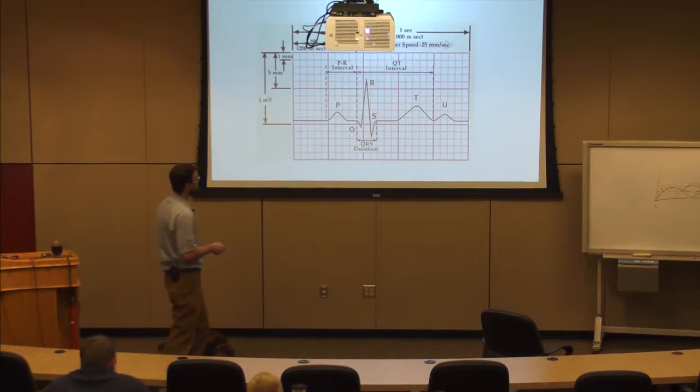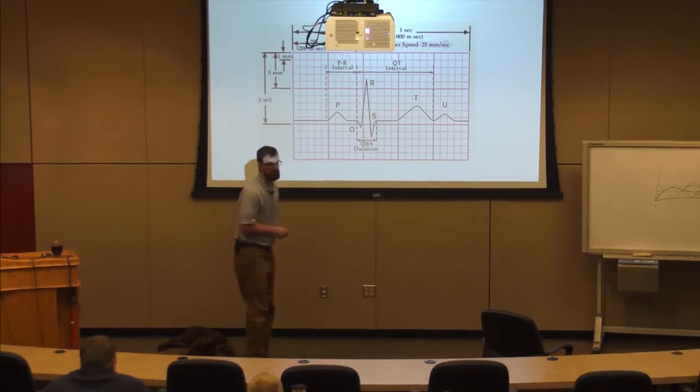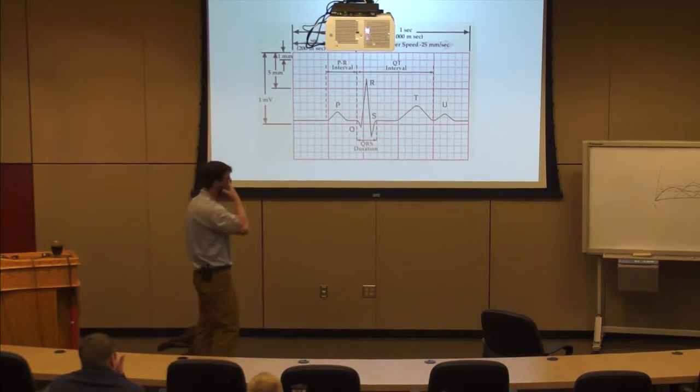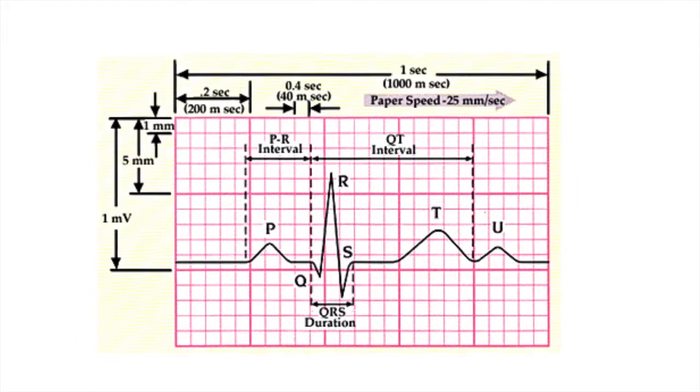So when I look at this and I measure these out, you don't necessarily need to know the exact time for each one, but you should be able to look onto a 12 lead and the basic grid pattern and say, that's slow, that's fast, right? So I know I'm one big box from the beginning of my P wave to the beginning of my QRS; that needs to fit within one big box, okay? Make sense?